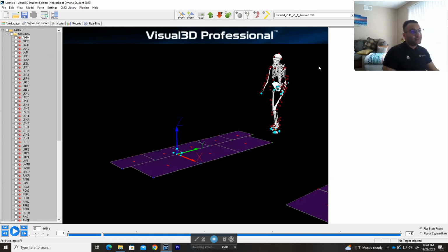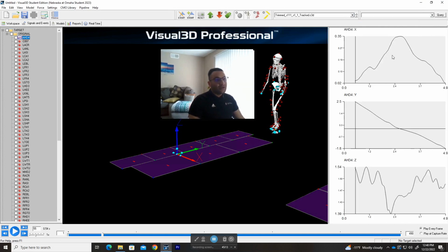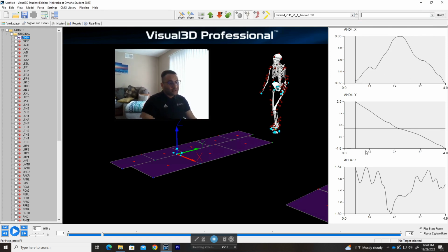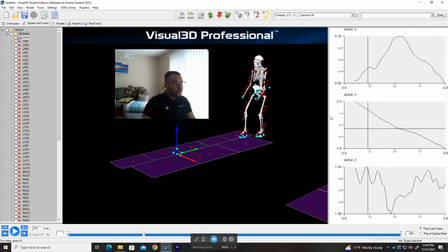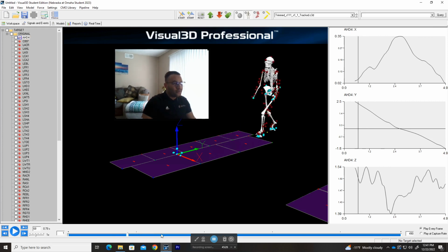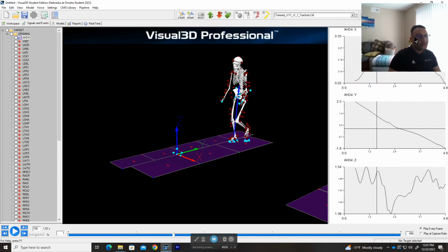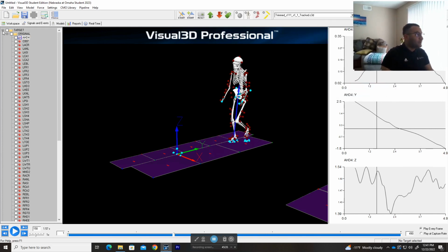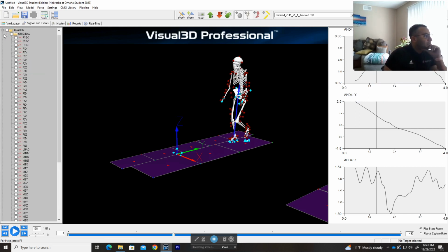Another very good thing here is that when you hit Control and then click on it, it will give you all the data on the graph section on the right side, synchronized in time with the actual data. So if we move here, you'll see the line moving in accordance with the actual data, and you see the actual motion file and your data there. All right, so that's the target, and you only have original now because we only have original. You can click on the plus or minus sign to expand or minimize, and then we go to the analog.